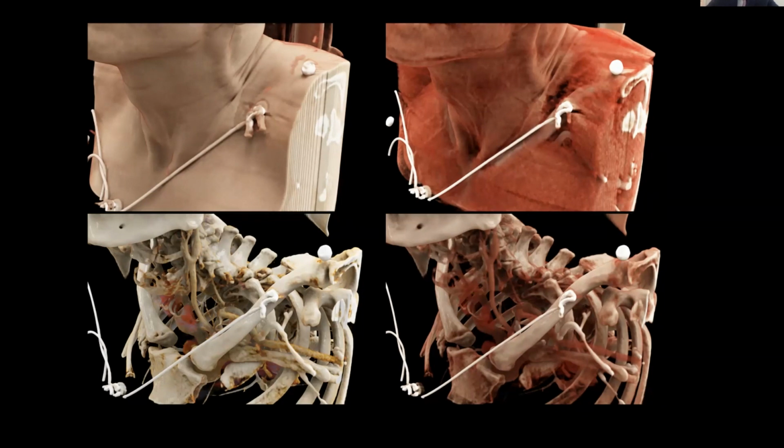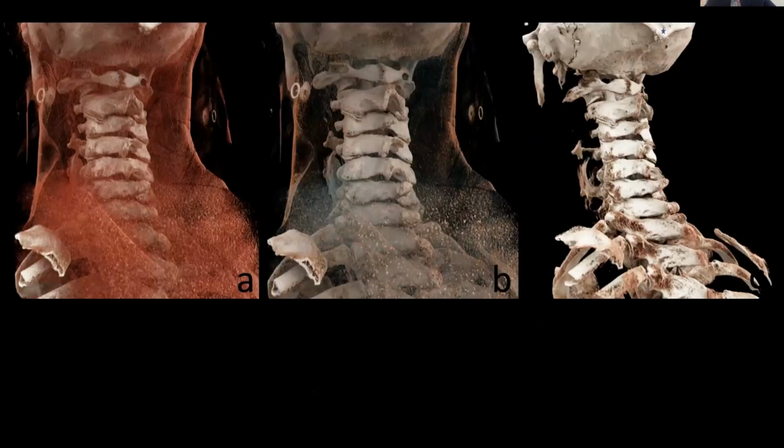So for example, if you were considering whether or not there's a small vessel coursing close to a tumor or something like that, you could filter that in or filter that out depending on the algorithm. And I think that's where a mistake could come in, not being aware of the fact that something is being filtered in a certain way. But I think overall the technology is reliable.